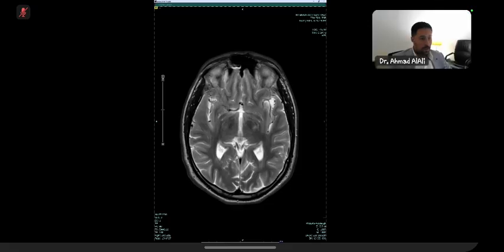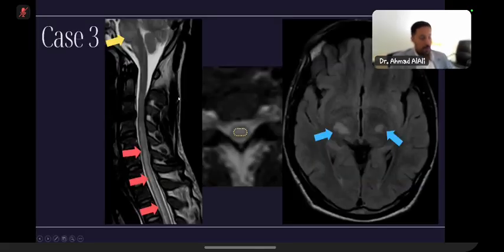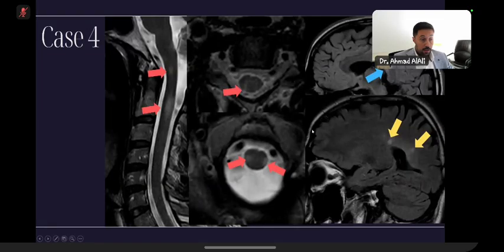Okay, right. So please stay with us. Thank you for presenting this case. I would like to take a minute to go over it again. Going back to the first case described by candidate one, there are hyperintensities in the pons and medulla and extensive hyperintense signal in the cord, which occupies more than two-thirds of the cross-sectional area, with involvement of the thalami and the gray matter.